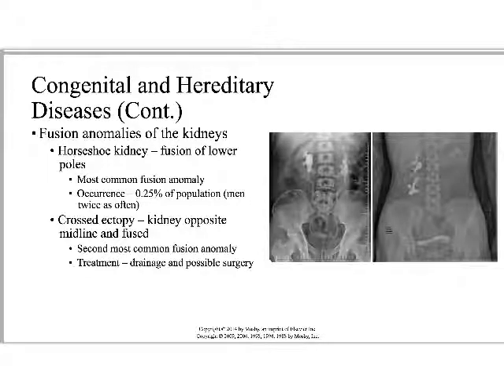You can see it, let me see. This textbook image here on page 230 was not really clear to me. I couldn't see where it was crossing the midline, so I went ahead and grabbed this. I think this is an IVU or IVP here, where we've injected contrast, and we can see it in the renal pelvis, and we can see how that renal pelvis is kind of crossing the midline, crossing the lumbar spine. So the kidney is basically this U-shaped, kind of partially connecting renal pelvis.